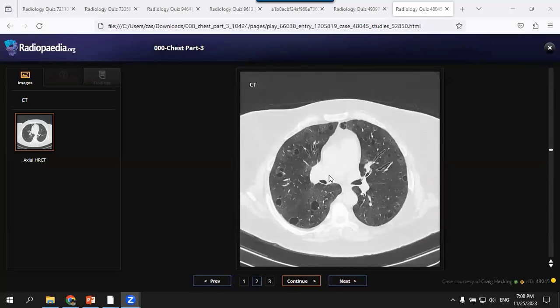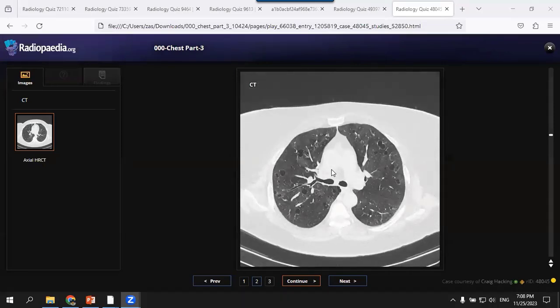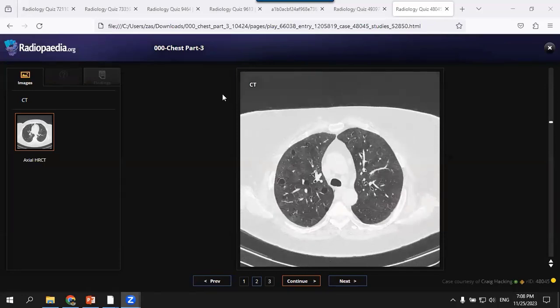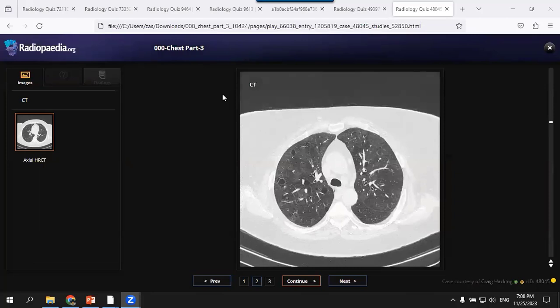Just to give a differential, no problem. Post-infectious pneumatoceles. What else? If it is stationary, I was going to say... Any specific history do you want to ask? Okay, smoking history, because of desquamative interstitial pneumonia associated with that. Very good. Yes. What else?